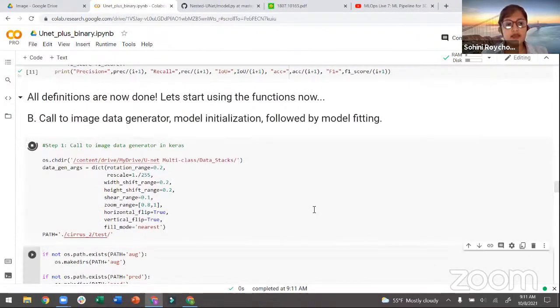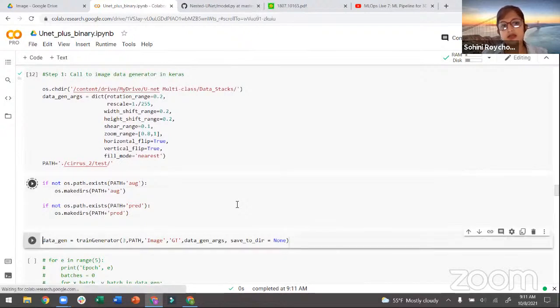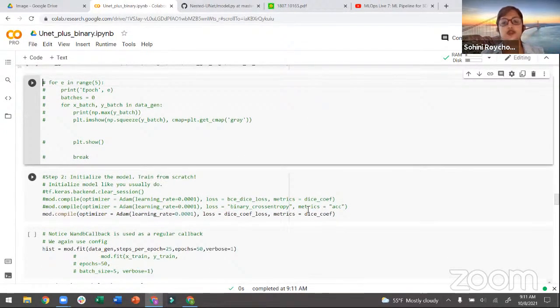So first of all, let's just pass all of the folders. And here, this is just making sure that if I want to augment, then I have a way to do that. I'm initially augmenting using just 3 images, right? So 3 sample images are going to be used together in order to generate augmented images.